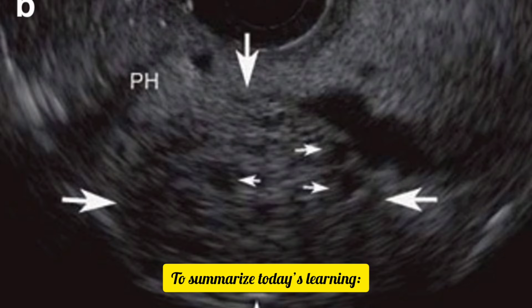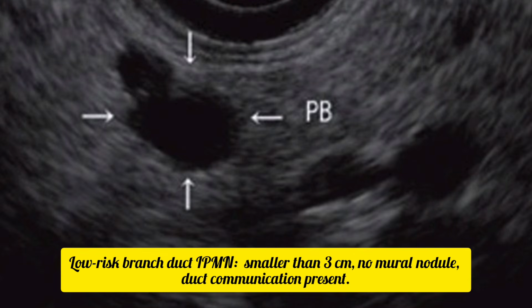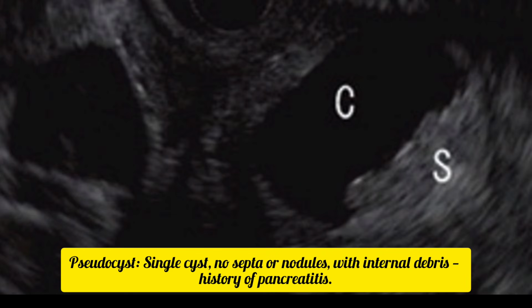To summarize today's learning: serous cystadenoma, multiple small cysts, thin septa, honeycomb appearance, benign, no malignant potential. Low-risk branch duct IPMN, smaller than 3 centimeters, no mural nodule, duct communication present. High-risk branch duct IPMN, larger than 3 centimeters, mural nodule present. Needs follow-up or resection. Pseudocyst, single cyst, no septa or nodules, with internal debris.